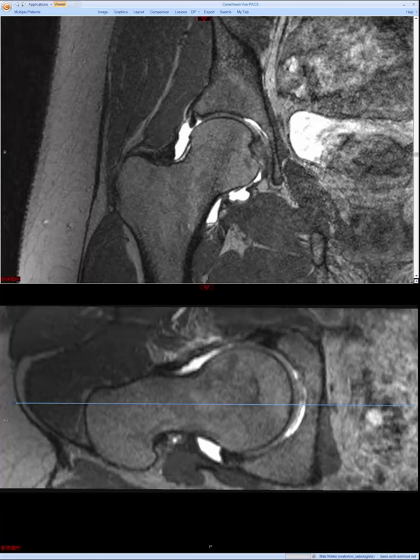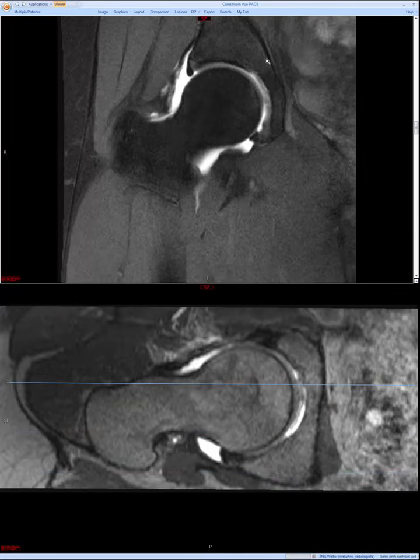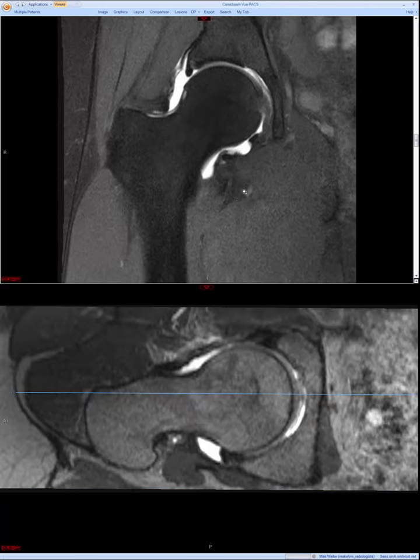You can see that on this dedicated hip arthrogram protocol, in this case we actually do see a fair number of the regional tendons and muscles, but there may be other cases where it's much more focused and you actually miss out on the trochanteric region, for example, or you don't see all the hamstrings, as is the case here. So once again, very important to tailor the MR examination to the specific clinical question, and unfortunately some or a lot of this depends on the referring clinician providing us with adequate history as well. But I think that's a discussion for another day.